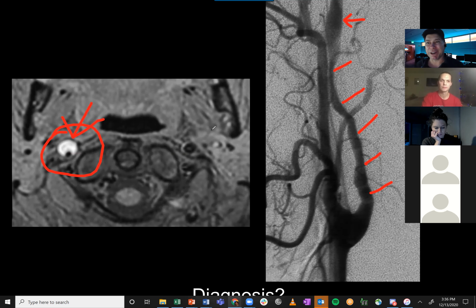But in other parts of the body, those rules don't apply, because there's no blood-brain barrier here. We don't have the blood-brain barrier here, and blood is going to evolve differently. So if we have blood mixing with CSF, and this is a tearing, a delamination, where we're tearing the intima away from the lamina, and the blood is delaminating along its blood vessel, it doesn't follow those normal rules.